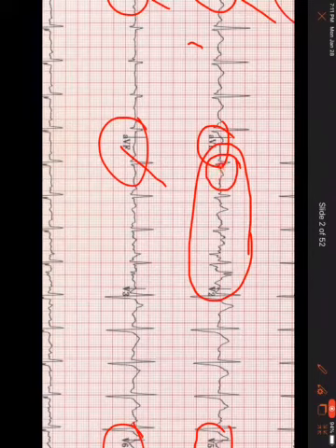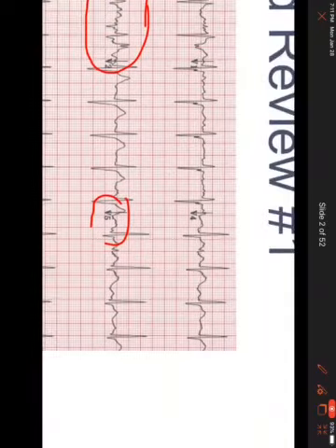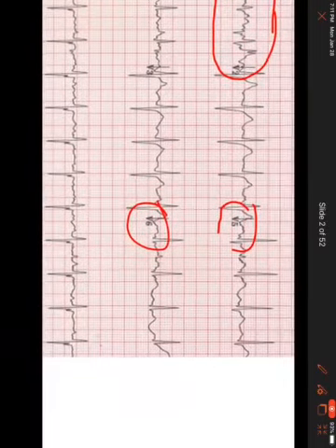Either way, this first or second beat is going to be our best chance to get a good interpretation. So if I put my laser where the ST segment or the J point is, again, I don't feel comfortable comparing that to anything isoelectric ahead of it. But if I go backwards, I can see that it is isoelectric. Okay? Now let's switch gears and look at V5, V6.